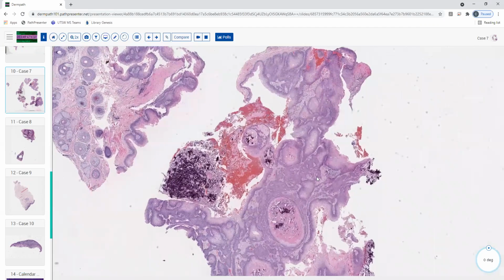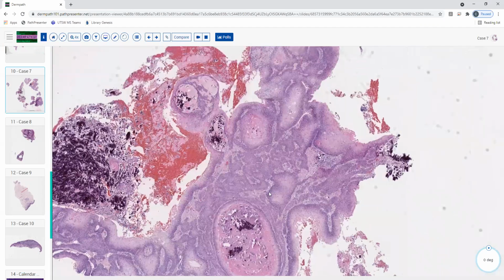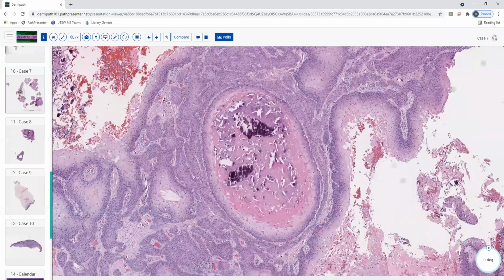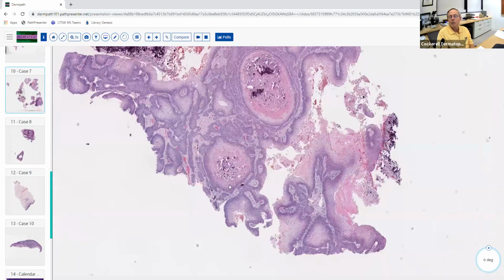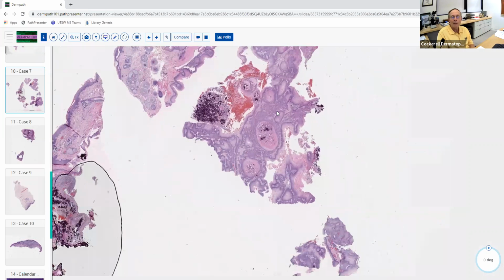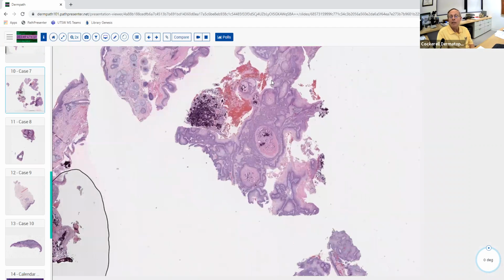It's hard to tell. I think usually it's benign, but there have been some cases where it's been invasive or malignant. And actually some regular old pathologists struggle with this diagnosis. It's a little bit challenging here because we don't have the entire thing. We've got what looks like a partial removal of it. And so it makes it a little bit more difficult to apply the classic criteria of small, symmetrical, circumscribed. But some of these lesions actually can be pretty large and they're still benign.